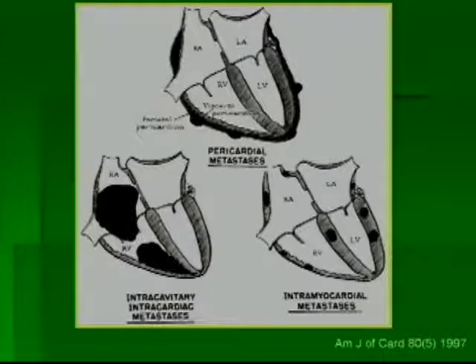When tumors go to the heart, they can show up in different places. Perhaps the most common is involvement of the pericardium. We can see here in the top middle of the screen. Then they can go to the myocardium, as you can see multiple studded areas in black here on the lower right-hand part of the screen, and they can also show up as intracavitary tumors, either just having the tumor material lodged somewhere within the ventricular or atrial cavity and setting up shop and growing from there, or perhaps even growing in from the wall.